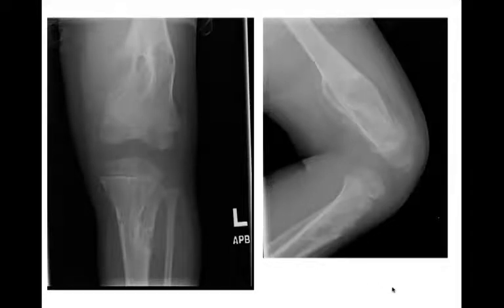So this appearance is typical of multiple enchondromas, and this is what the enchondromas look like in the long bones in a patient with multiple enchondromatosis. What you're seeing is these tunneling cartilaginous tracts which are growing from the physis and extending into the bone. So this is really just one big enchondroma here. They have this very typical appearance. They're always going to tunnel from the physis into the metadiaphysis. So if you see this, this is really pathognomonic for multiple enchondromas in a patient. I don't know if they had Ollier or Maffucci, which one it was, but multiple enchondromatosis.